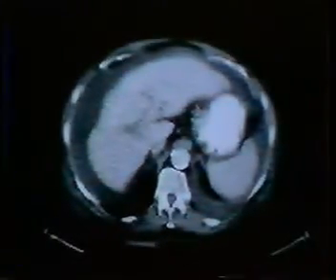First is lateral displacement of the crus. That was the very first one described, and what it states basically is that if you have fluid that is pushing the diaphragmatic crus laterally, that has to be pleural fluid, whereas if you have peritoneal or even retroperitoneal intra-abdominal fluid present adjacent to a crus, the crus will not be pushed laterally. So this, for example, must be pleural fluid because it's pushing the crus.